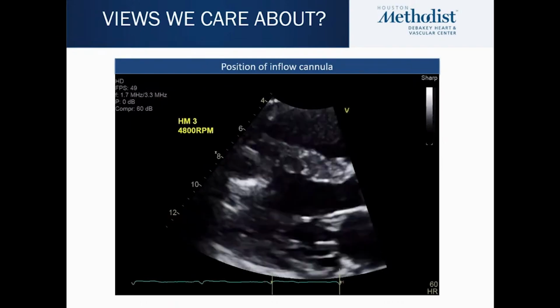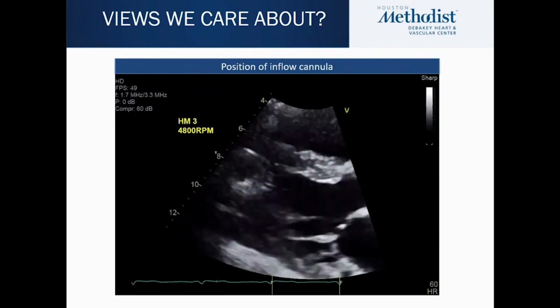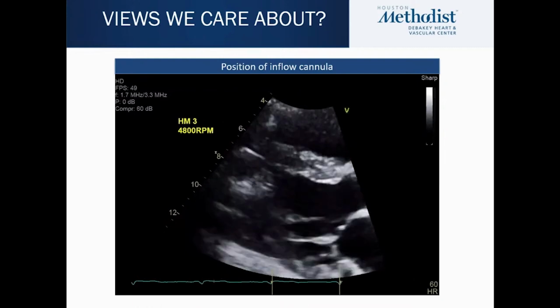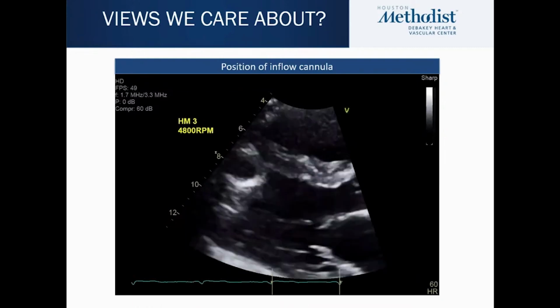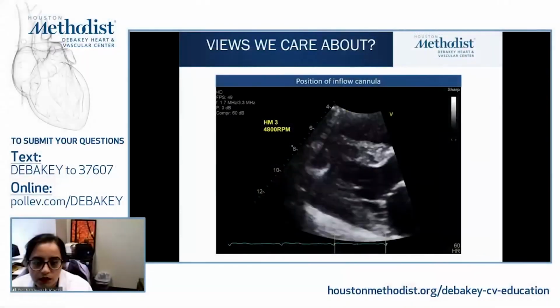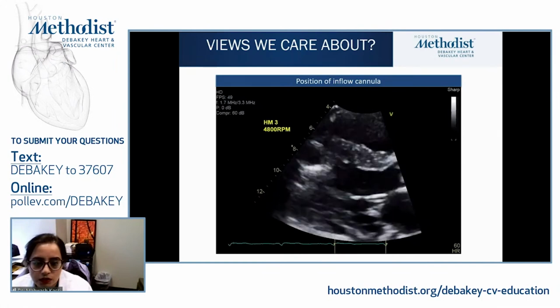This is somebody who had been having a lot of arrhythmias. Their presentation was that they were having a syncopal episode anytime they bear down. So this is where it is important to understand the position of the inflow cannula relative to the septum. And I'll talk about this in my talk a few slides later. It's also important to sometimes demonstrate what happens to these patients when they change their position.